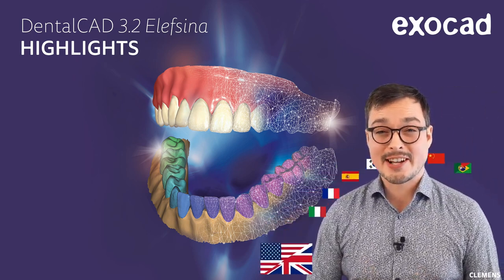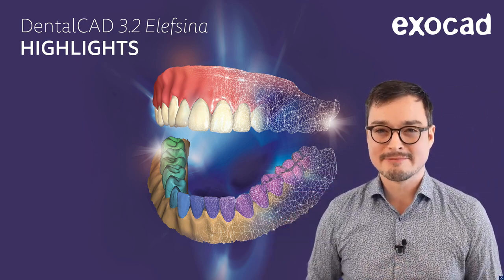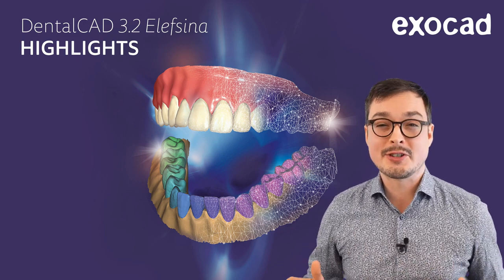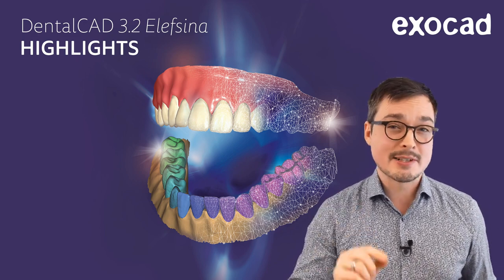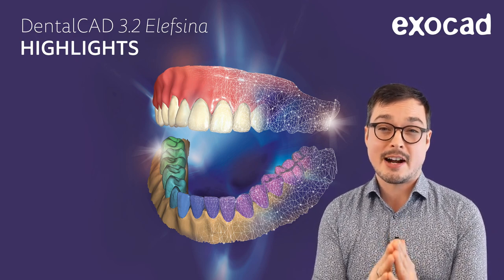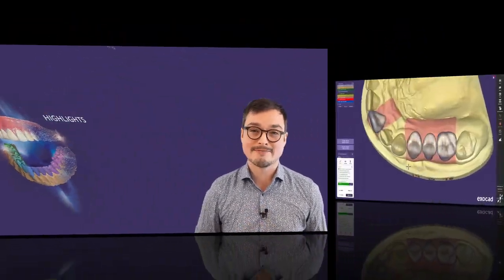Hello, I'm Clemens from exocad. Welcome to this video tutorial. DentalCAD 3.2 Elefsina presents plenty of new features, more automation and seamless integration to you. Let me introduce you to our personal highlights by starting the brand new release right away.